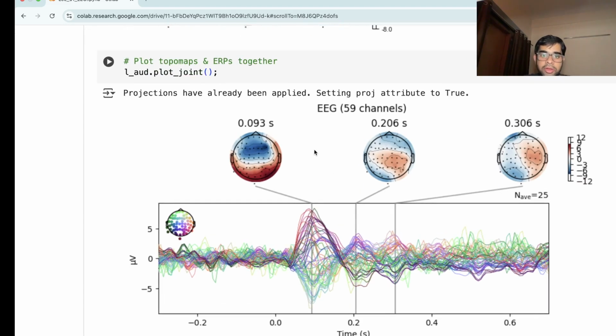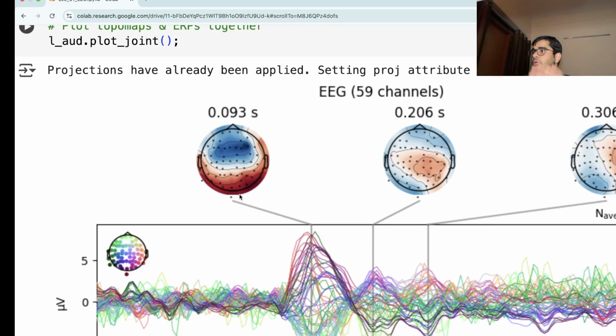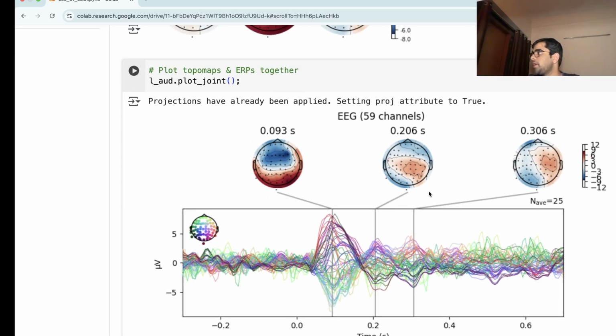It is a 2-dimensional plot with electrodes in their corresponding locations, and you see iso lines here. These are lines which have the same amount of activity, the same amplitude of ERP. This is the topograph or topo map that we usually call. Is it fine?